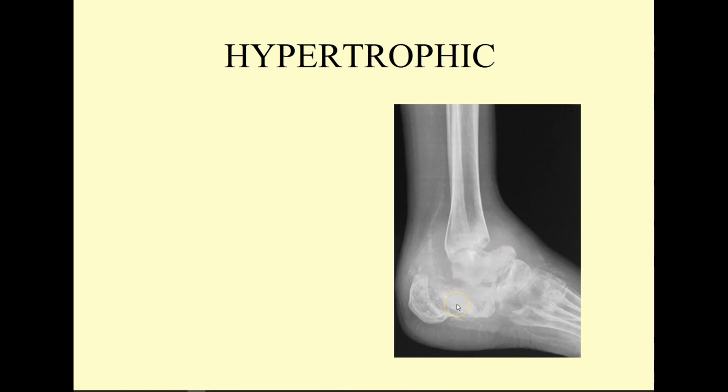I also see some areas where there's significant increase in density, which is kind of typical of bone death, really. This patient, believe it or not, could walk on this foot because of the reduced sensation. And if you were to hold this foot in your hand, it would be all kinds of crunchy and very mobile. So dislocation is part of the presentation.